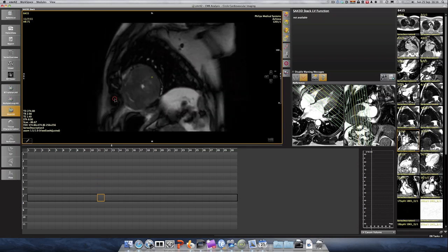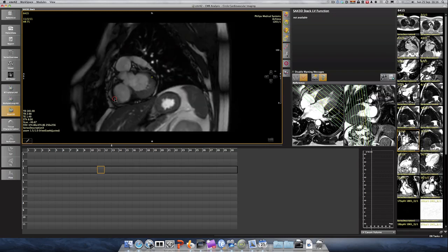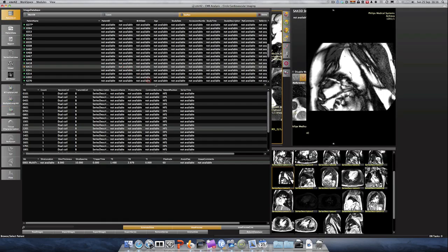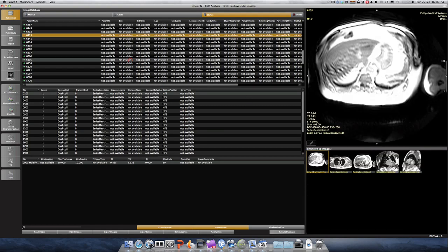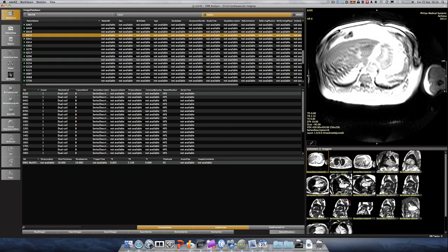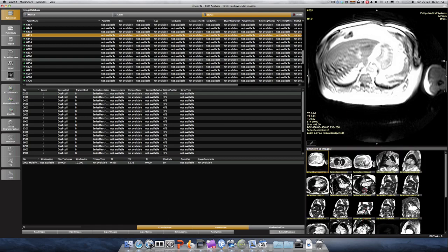And then you go down, and then it becomes difficult to draw because of the hypertrophy. And that's how I would choose the basal slices. Now one more, and then I think you get the idea, but you also get the idea that actually analyzing the RV is not that easy, and you need to do loads of them, and compare your LV stroke volumes to the RV stroke volumes to get confident that you're picking your basal slices correctly.